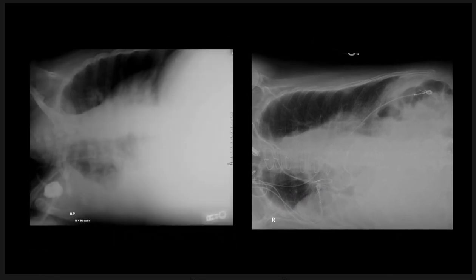Compare and contrast that with another patient. Color this in for you. You can see how that's flowing more with a meniscus type look. And this is larger volume, so it's not completely linear, but it doesn't have that outward bowing that we're seeing with our loculated case.